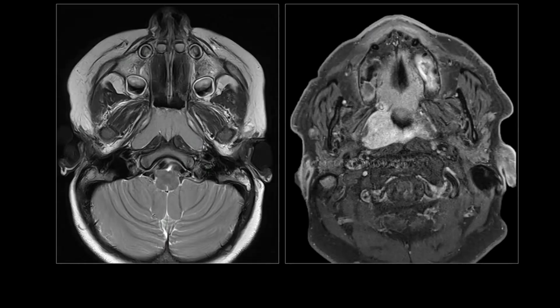Okay, that's it when it comes to the anatomy of the nasopharynx. I'm not going to go into detail on nasopharyngeal pathology. That will be for another presentation. This is just about anatomy, but I'm just going to give you some generalities on pathology. I think there are two things you have to know at the moment.